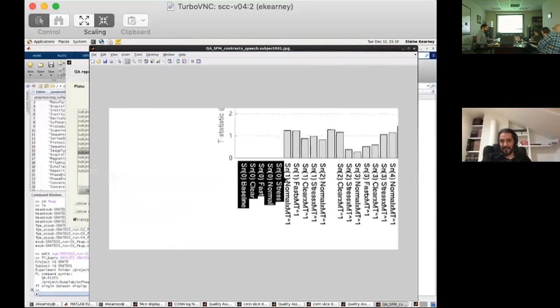So what then, when we see the parentheses 1, is this like, so now we're looking at the normal by movement time. So there's this. Right. So the parentheses are the session numbers, and the ones that we see in the effects are anything that is in the design matrix. So every column in the design matrix corresponds to one effect, or at least in this lingo, right? And those are the names that you're seeing in this SN1 normal times MT to the one first power.